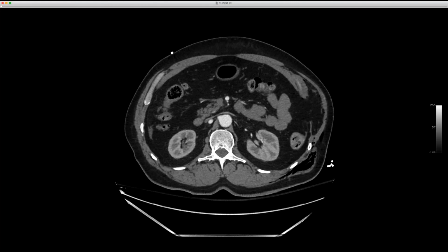I've lost my coronal buttons, but it's still loading, that's why. Probably tore the diaphragm away from its chest and abdominal wall mooring out laterally. So you probably tore it out there along with the chest wall and abdominal wall being torn. So sort of a lateral injury. That was just an unusual one.